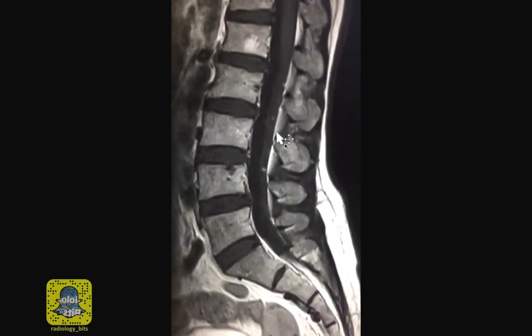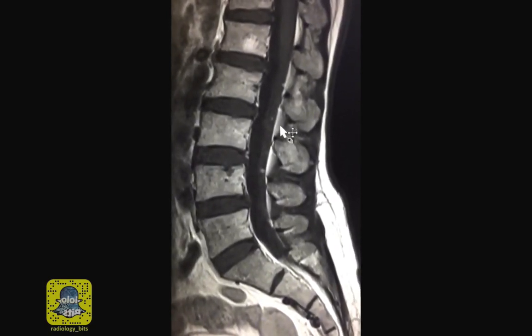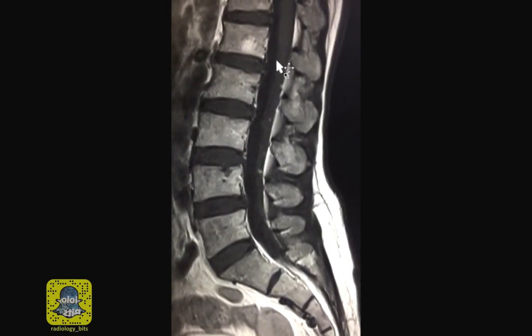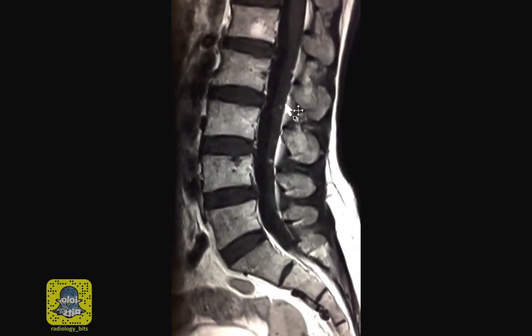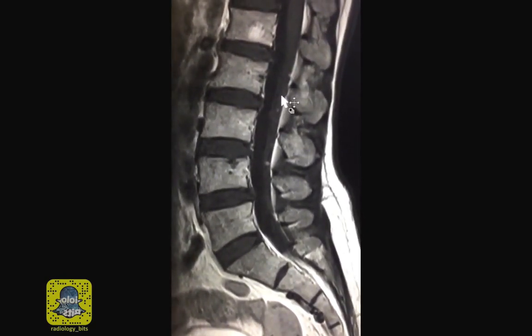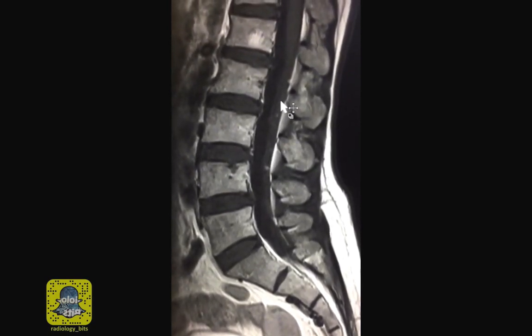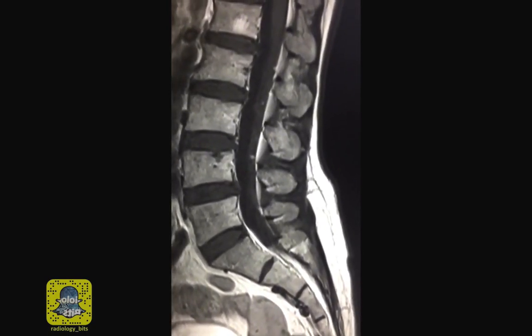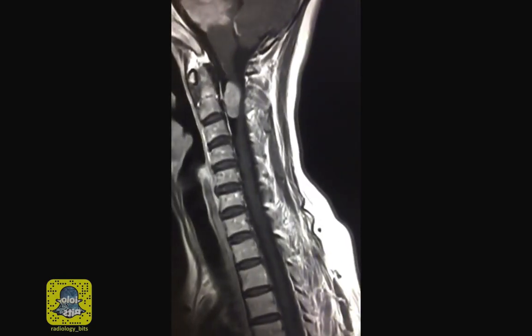Once you see multiple tiny nodular enhancing abnormalities of the cauda equina, you have two main categories. Metastasis, whether that's from CNS drop metastasis or extra CNS lesions, versus neurofibromatosis type 2. The distinction between those two categories is usually easier when you know the clinical information. And whether you're thinking about metastasis or neurofibromatosis, image the entire neural axis.